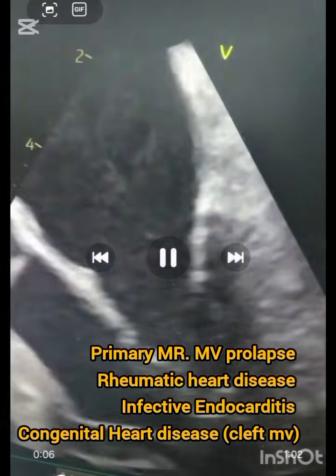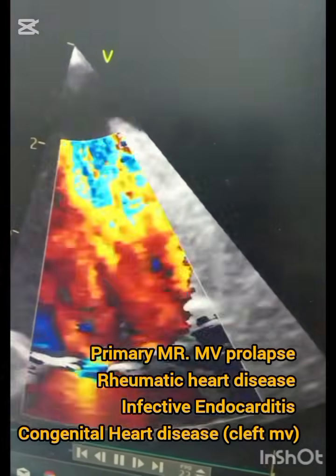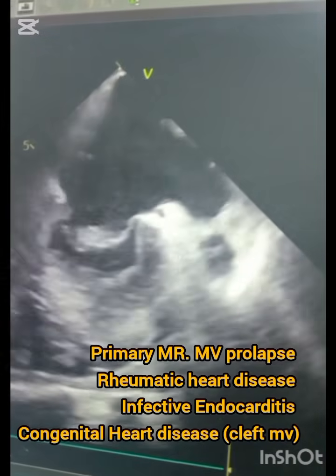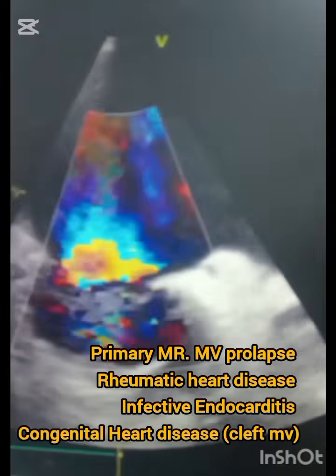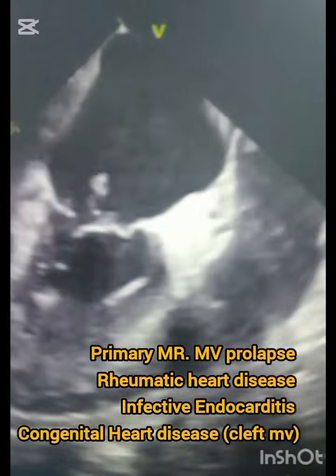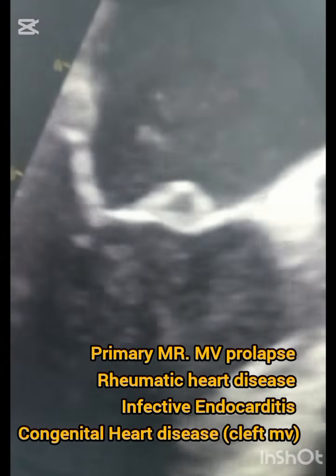Mitral regurgitation can be divided into two basic categories: primary MR and secondary MR. Primary MR results from disease with intrinsic abnormality of the mitral valve apparatus, like mitral valve prolapse, rheumatic heart disease, endocarditis. As you see in the image, there are vegetations on the leaflets and also an abscess-like cavity which is perforated, and congenital cleft mitral valve leaflets.